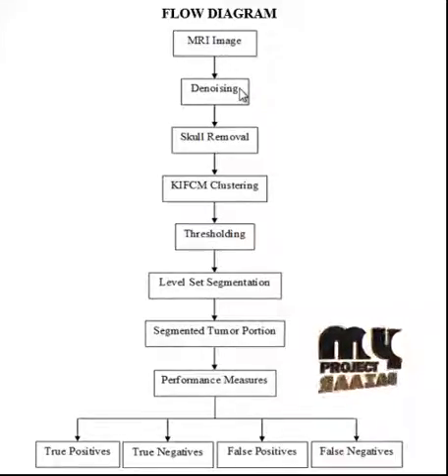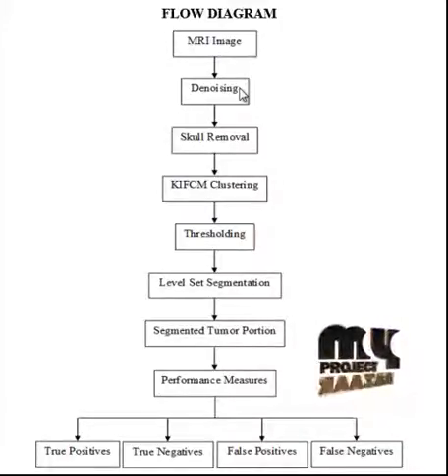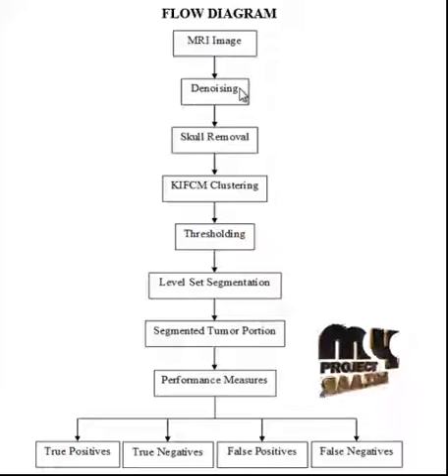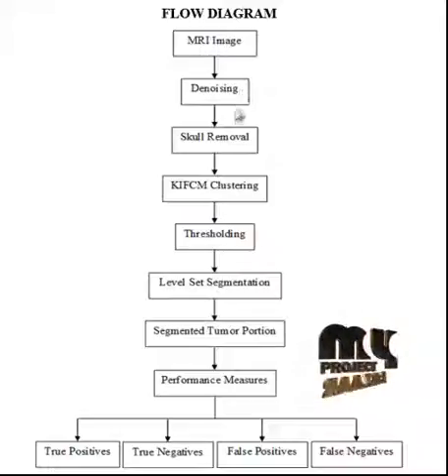Median filter is employed to smoothen the image and to filter the unwanted pixels in the images. Median filter passes through the input image pixel by pixel, replacing each pixel with the median of the neighboring pixels, thereby providing normalized intensity in the overall image. The noises in the images were replaced by the above process.